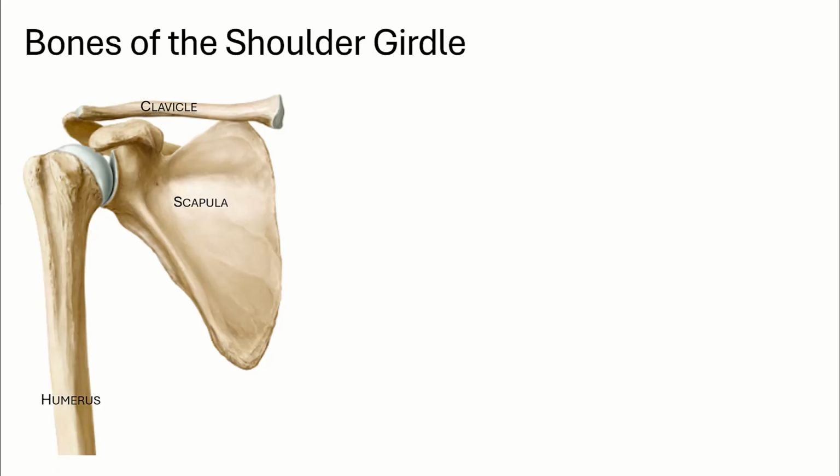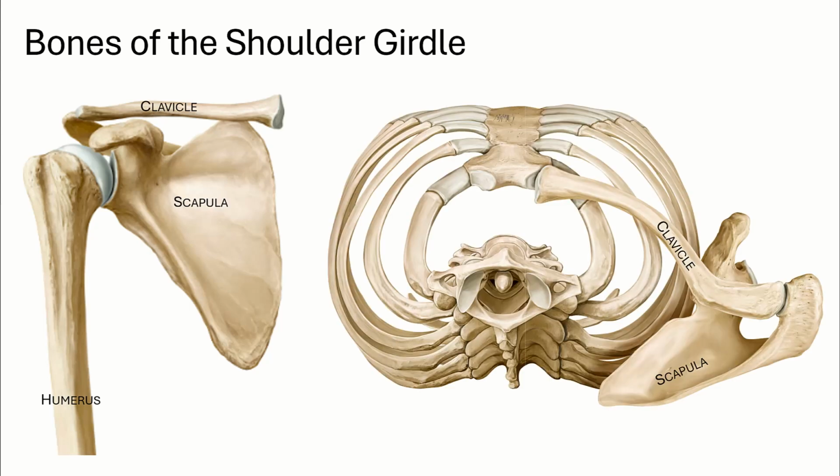Notice how the lateral portion of the clavicle butts up against a structure from the scapula, while also going over another scapular structure. To better see this relationship, we'll look at the view of the top of the shoulder on the right. Notice this is the opposite view you get when you look at imaging. Imaging is looking at a person from their feet as if you're standing at the foot of a bed. This anatomy image, as is common with most anatomy diagrams, is from the opposite side, from the head looking down.